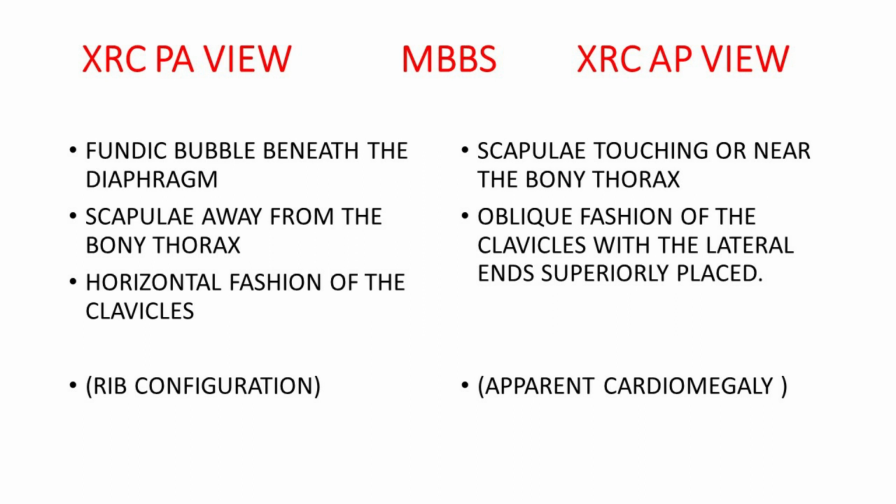In quiz number 5, there is visualization of a fundic bubble with an air fluid level, which is highly suggestive of PA view. But my X-ray technician did it in AP view because the patient had undergone pacemaker placement just a few days back and he was in a lot of fear. He did the X-ray chest AP view with the patient in standing position. So that's why you can see the air fluid level, but still it's an AP view.